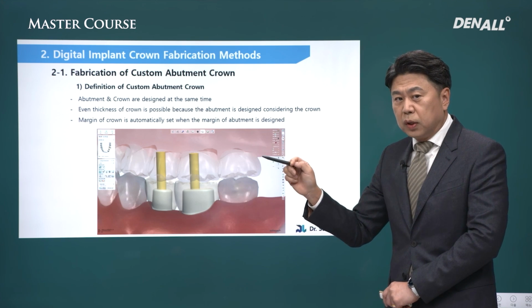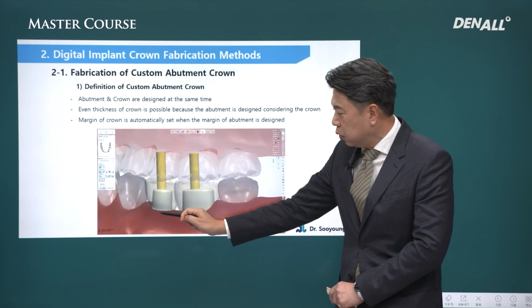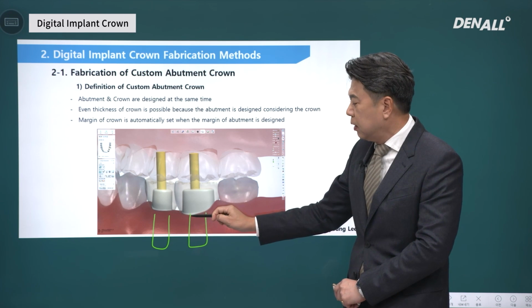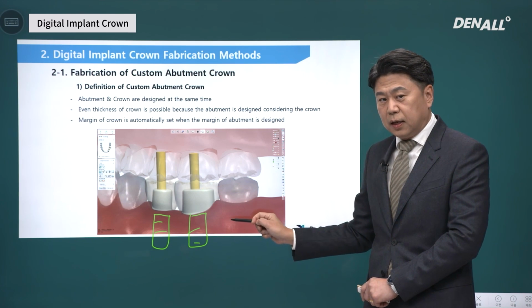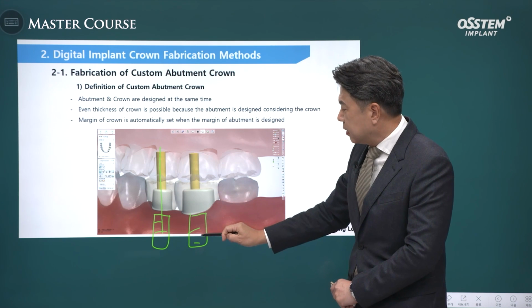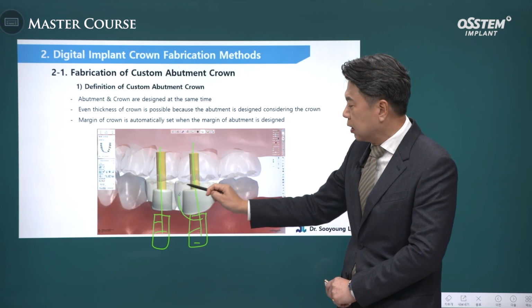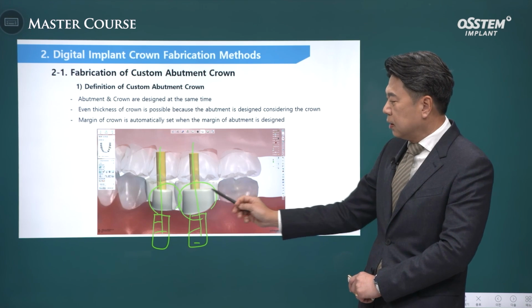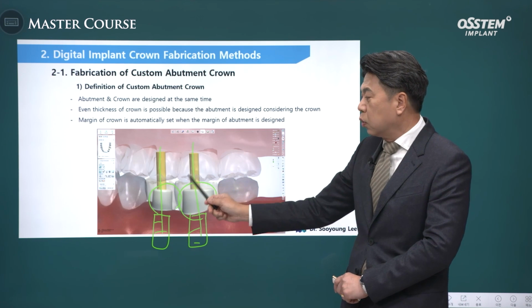The digital data from the scan body, they are not visible here, but there are virtual implants here. The data of accurate positions, depth, and angulations are already set here. Automatically, the axes are determined, so the abutments can be freely designed appropriately, considering the path of the adjacent tooth and the path of invisible implants placed, or the relationship with the opposing teeth.